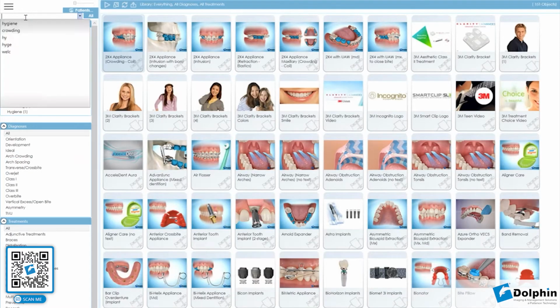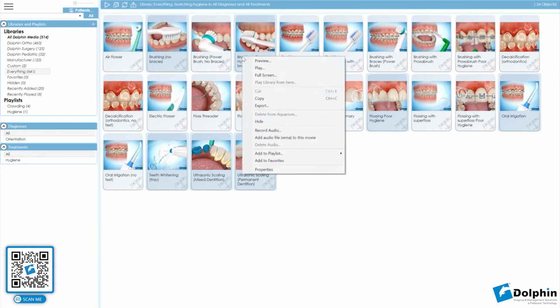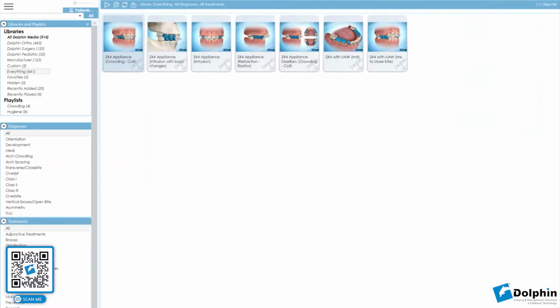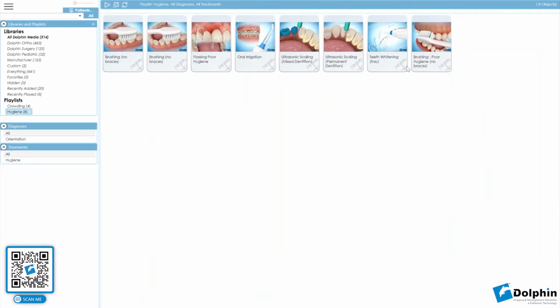Now, I believe we can highlight multiple videos. So we can click on one here. And then what I'm doing is I'm holding down the control key on my keyboard and clicking on each video that I would like to add to my hygiene playlist. Once I'm done, I simply right-click on one of the selected videos and then select the playlist I would like to add them to.